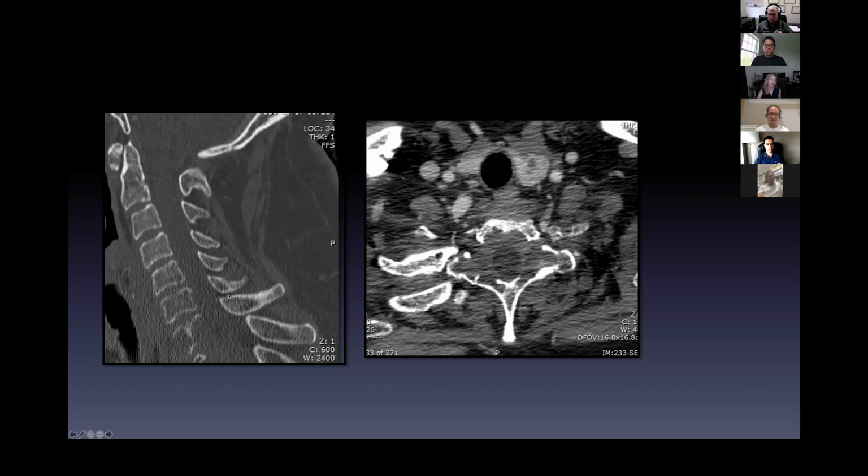No? Okay. So we see that it is definitely a lytic tumor. We see on this axial that it's not permeative. It doesn't look aggressive like lymphoma or renal cell or anything like that. It has these thickened struts, which are seen with tumors that are more indolent and are slower growing. This almost has a mini brain appearance. If this is a radiology term, I don't know if any of you in neurosurgery know that, but that kind of gives away what this is.